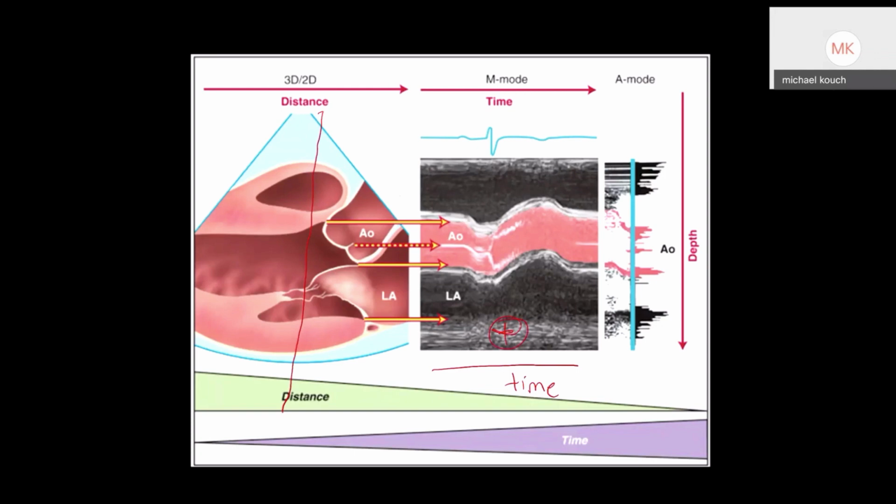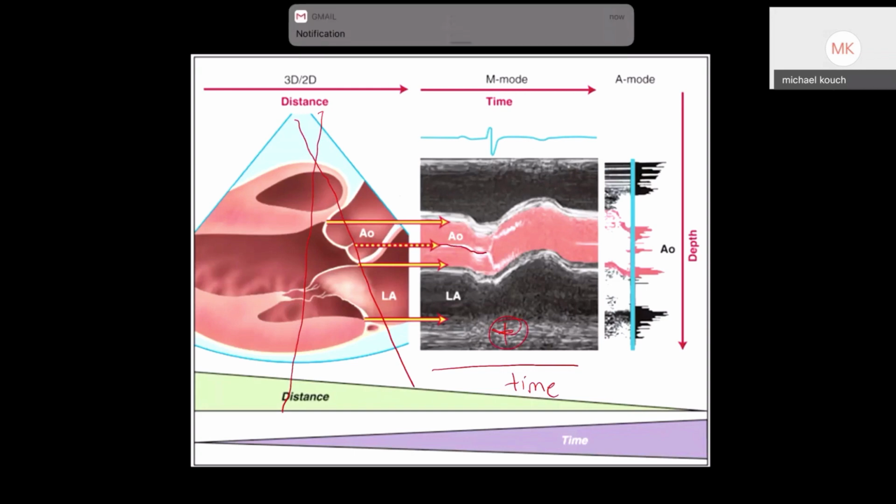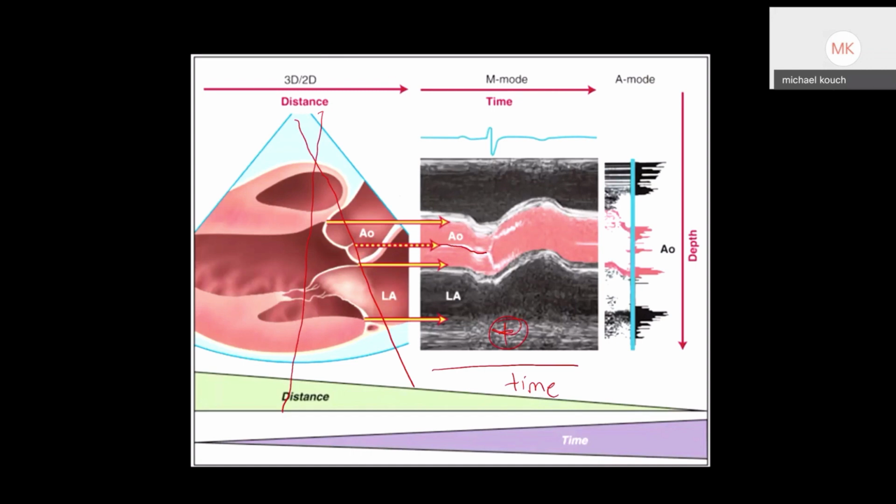So this image in particular, if you take a look through the line that I'm drawing, is going right through your aortic valve, and we'll go through the aortic valve in particular here. As the aortic valve is closed, we see our line marked by this red line that I'm drawing here, and as it opens, we see that the valve itself opens, okay?